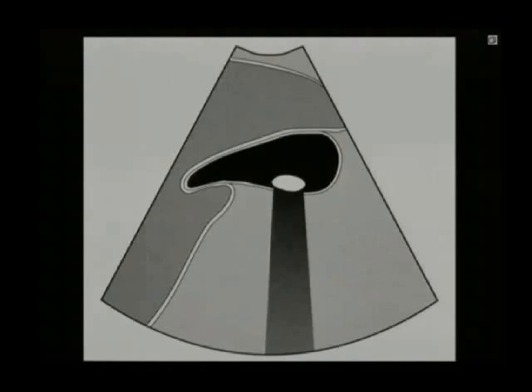On the second day, he filled the gallbladder with fluid. He put the bile in the gallbladder, and when you have this fluid tissue interface, you'll get great ultrasound images. And that's why every indication that we do in ultrasound will more or less have a fluid tissue interface. And those will be the best indications, at least. And then on the last day, he made the pathology echogenic. So we have all the characteristics of a great ultrasound in the right upper quadrant, and that's why still today ultrasound is the best modality to scan and image the right upper quadrant.